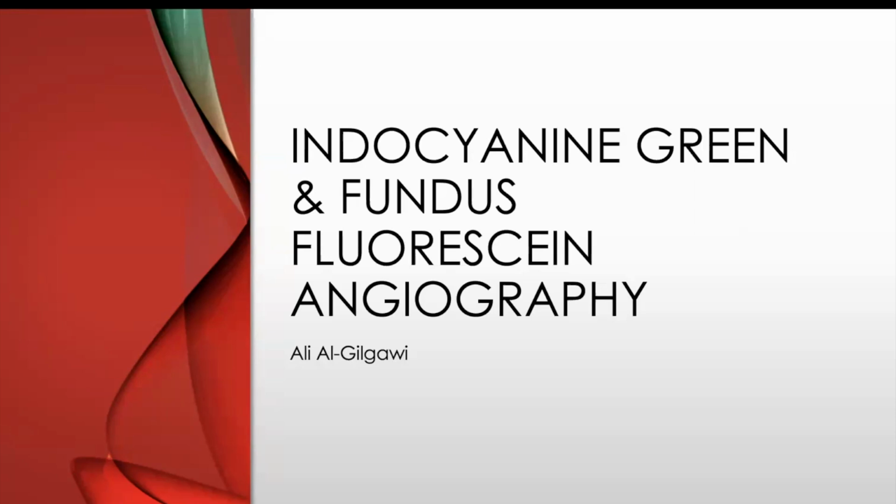And I find in terms of general practice in your exams, the FFAs tend to be where the meat of the information that you need to know is from. So it's very much worth getting your head around how FFAs work and what they may look like.